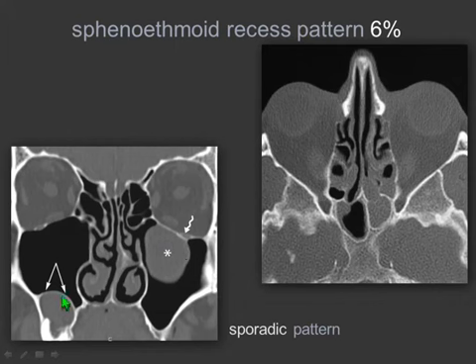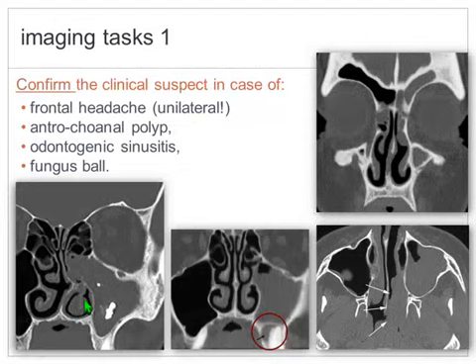and mistaken for this condition, because in this condition you have the lesion that is composed by fluid, but it is a lesion related to the root of this molar tooth, and you see that the wall, the floor of the maxillary sinus has been raised by the progressive increase in size of this cyst related to chronic infection of the tooth.